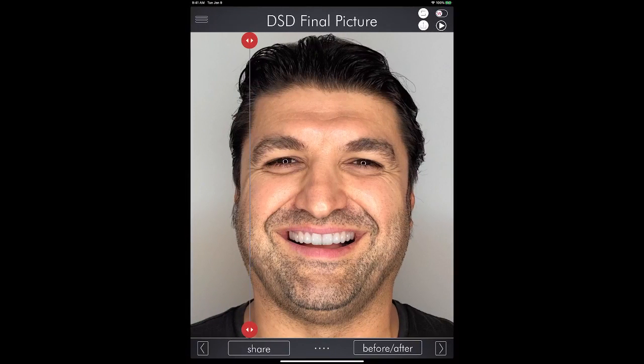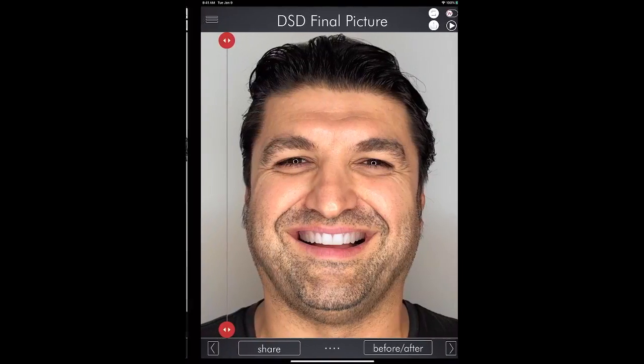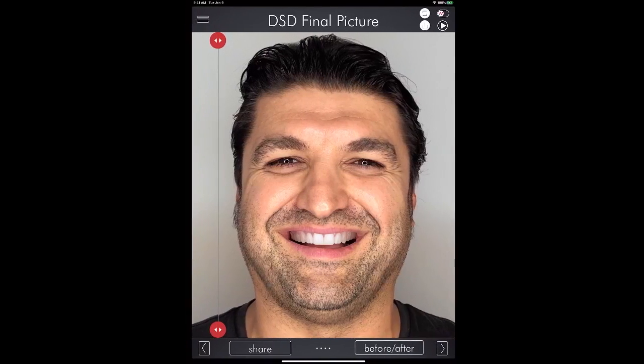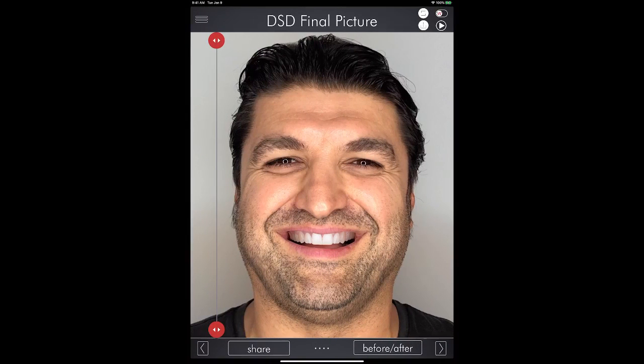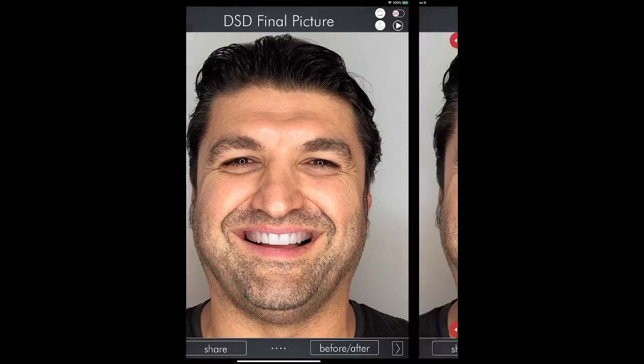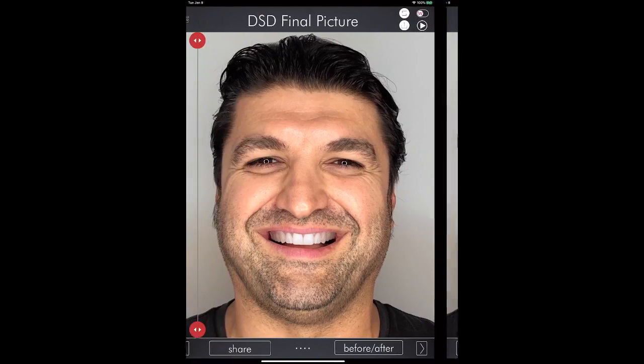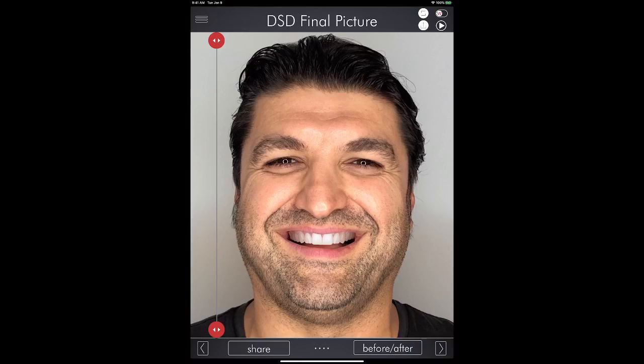And I think this difference between the first and the second smile, so this one is beautiful, round, harmonic. This smile is more edgy. And Kyle Stanley smile donator also edgy, but very natural, right? Because we use natural templates.